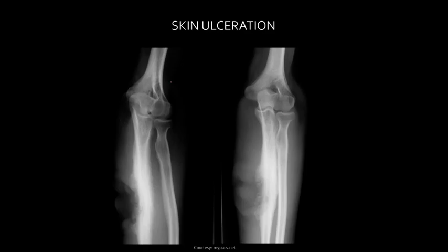Another example of that skin ulceration and or Marjolin's ulcer. So I would consider this as a Marjolin's ulcer here. So in this patient with this sclerotic change, periosteal reaction, and this kind of scalloped out area in the skin, bad changes, squamous cell carcinoma or Marjolin's ulcer.